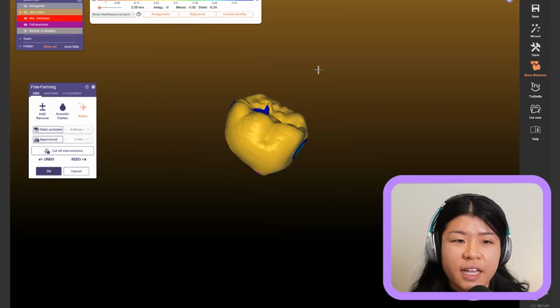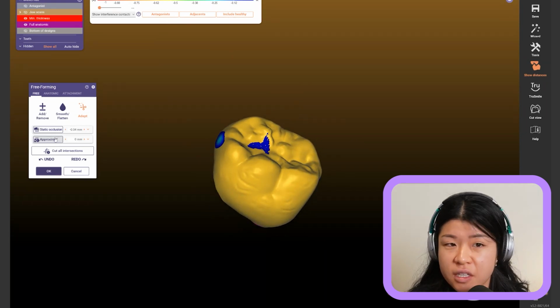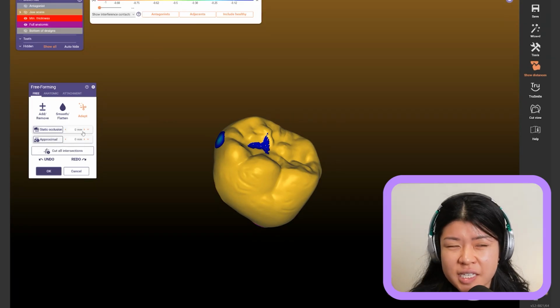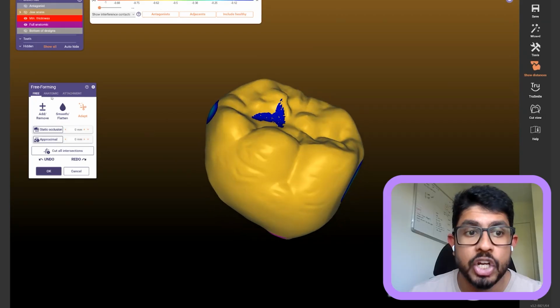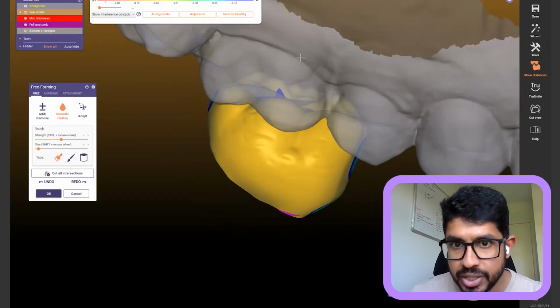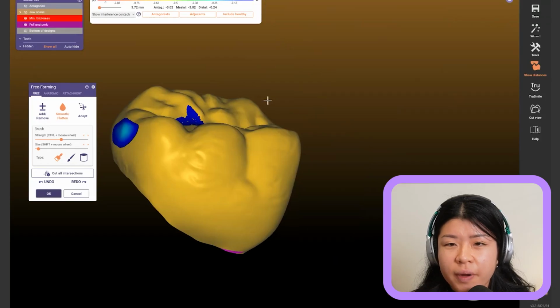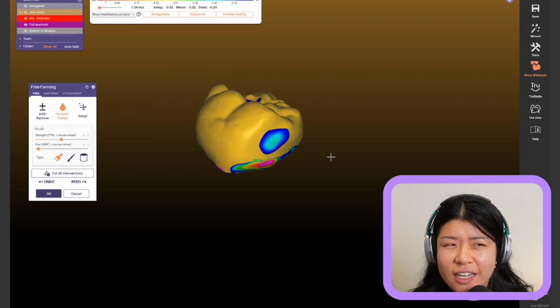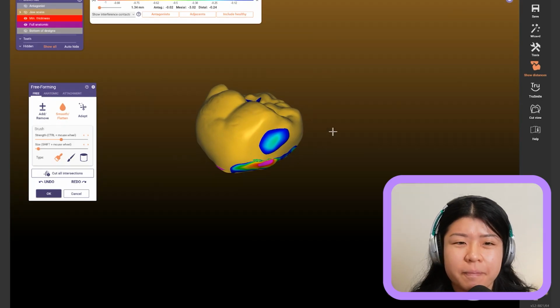Sure. So here we see these blue occlusal contacts. Blue is representing the zero. The zero, exactly, the zero that I have. Is that indicating how much space is between this and the antagonist tooth? No, that's not the space, it's more the contact point. So this is actually exactly touching at that point, if you notice over here. It's exactly touching one another, right? Whereas if you had negative, then it would be, I guess, tighter, heavier in occlusion. If you had a negative, it'll be heavier in occlusion, correct? Yeah.